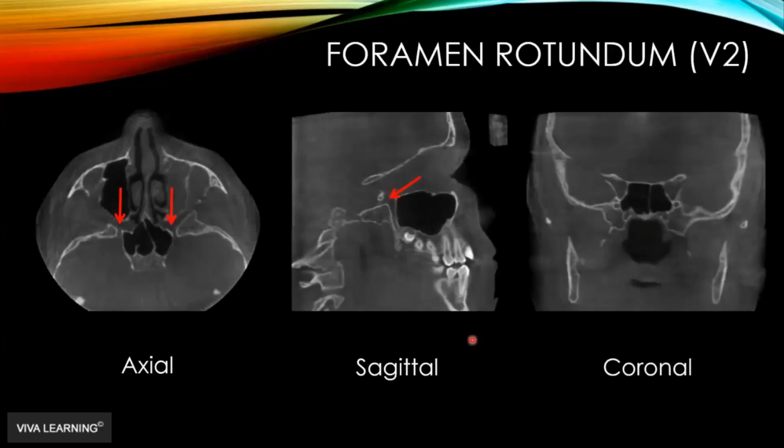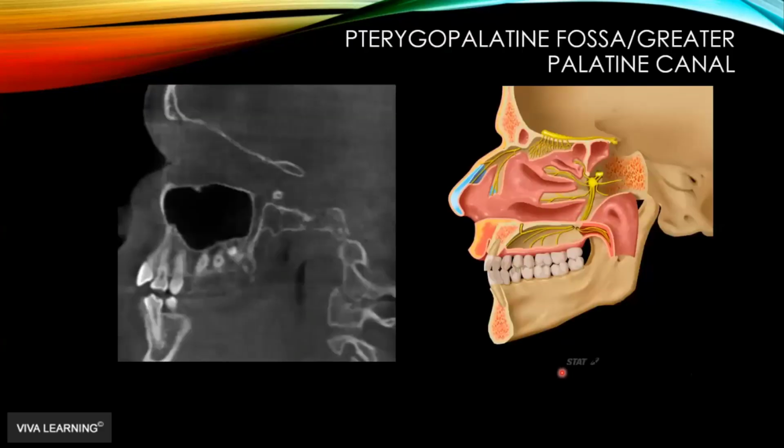And this is that typical view that, if you remember from your anatomy lectures, everyone said the sphenoid bone looks like the great horned owl. And so here's the horns, and here's the lateral pterygoid plate. We don't really see the medial here, but those were the feet. And then these little beady eyes, that's foramen rotundum. And so that's what we see in the coronal view. So that transmits the maxillary branch of the trigeminal nerve.